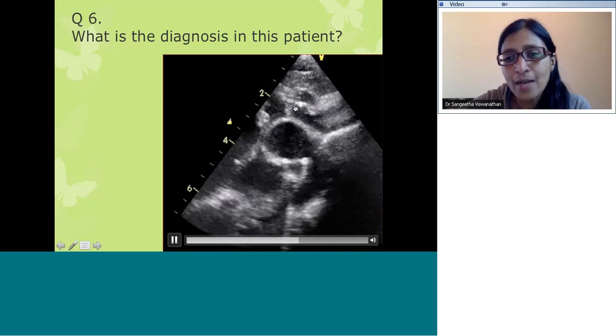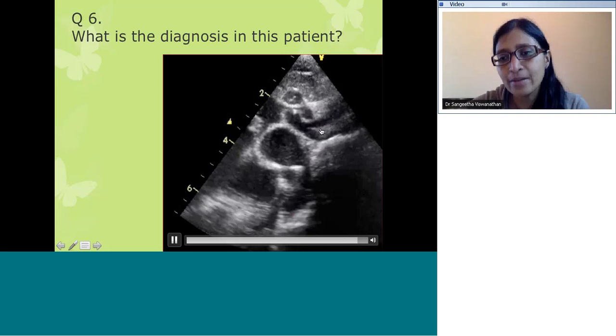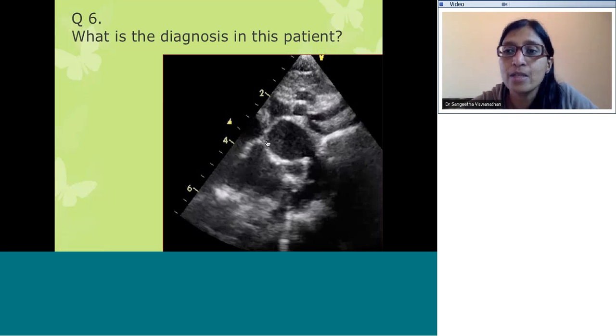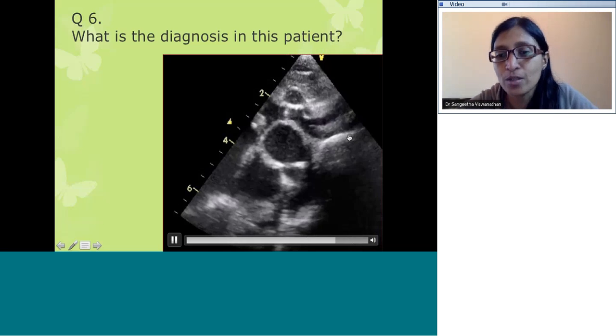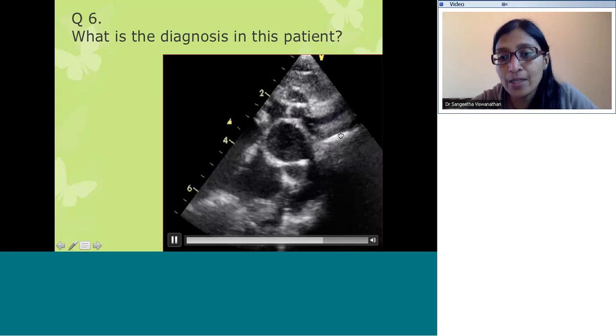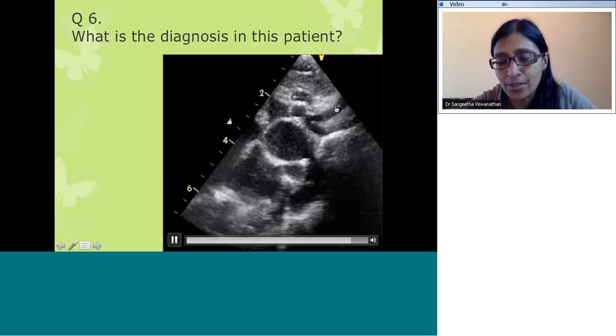So this kind of an appearance, okay, where there is an abrupt ending. These are the head and neck branches. Of course, each head and neck branch has to be identified. So just looking at one clip and saying this is such and such a branch is not of much value. I can tell you that this is the left subclavian artery, okay, and this is the left carotid.